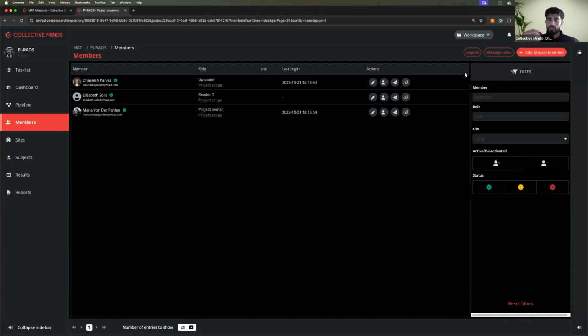And Ellie, can you export just a portion of the members if you wanted to? Yeah, actually, I'm going to give you a pro tip. Yes, if you use the filters, for example, you want just to export a list of members that belong to a site, you filter by site, and when you click on the export button, you will have that list only. Or maybe you want to export a list of people that have the image analyst role in your project. So again, you just filter, click export, and the CSV that you're going to get is already filtered by the things that you applied.